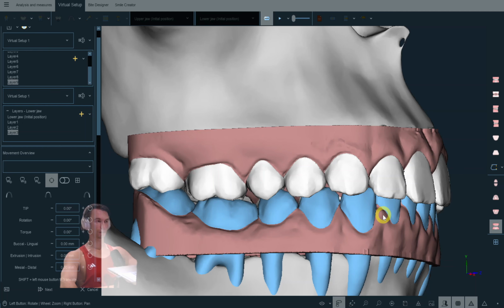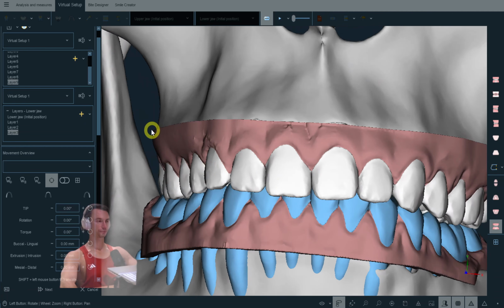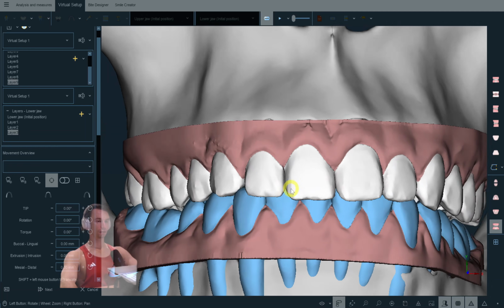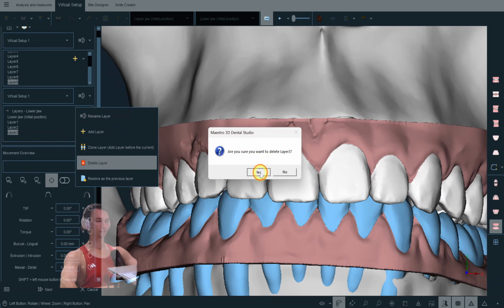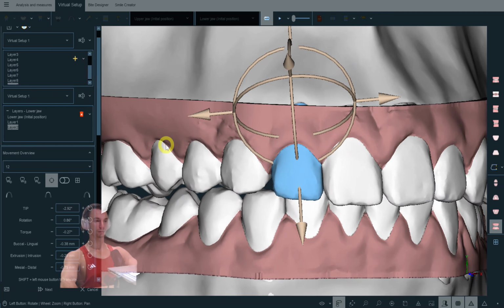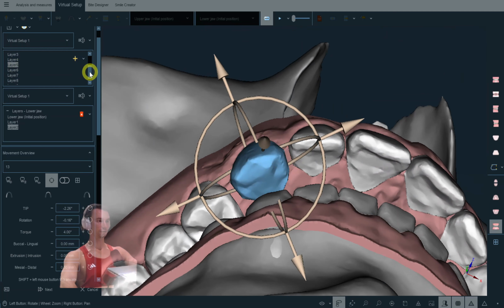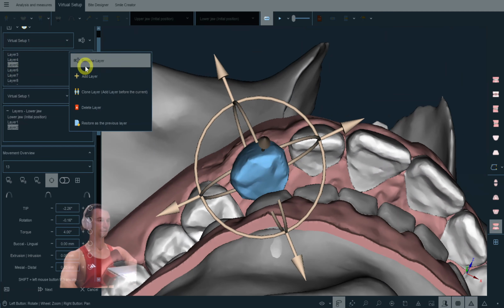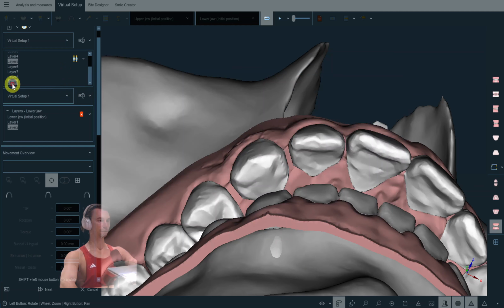Okay, we can increase the amount of distalization here. Surely, but why wouldn't I do that? Is because I don't think that we can move the incisors bodily that much. Look, if we make, let me make some extra layer. I don't know how to do that.